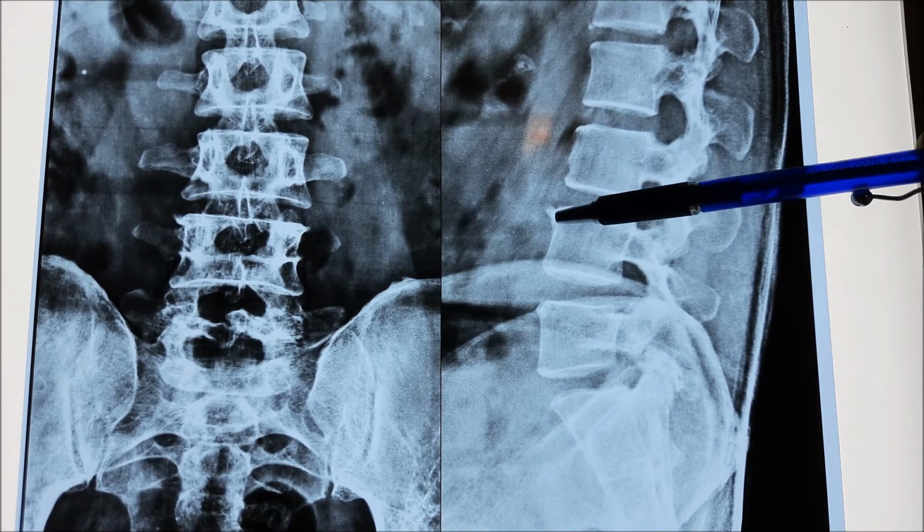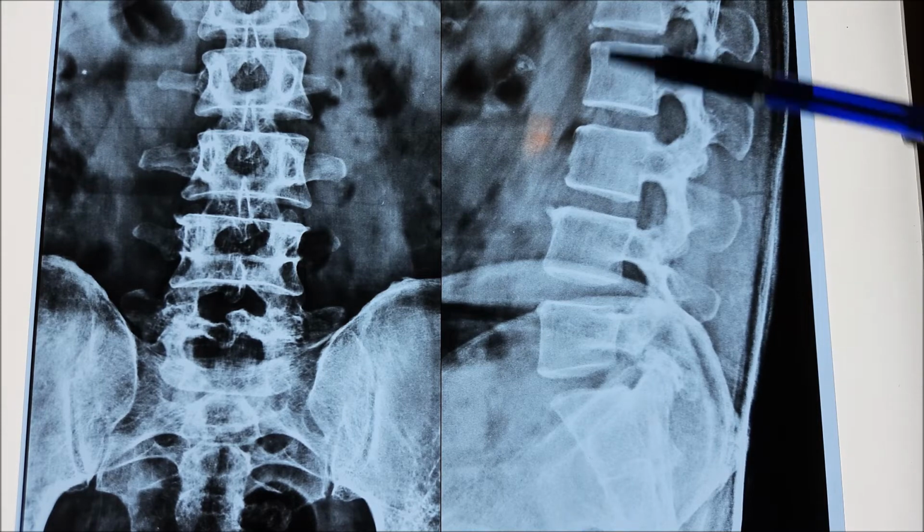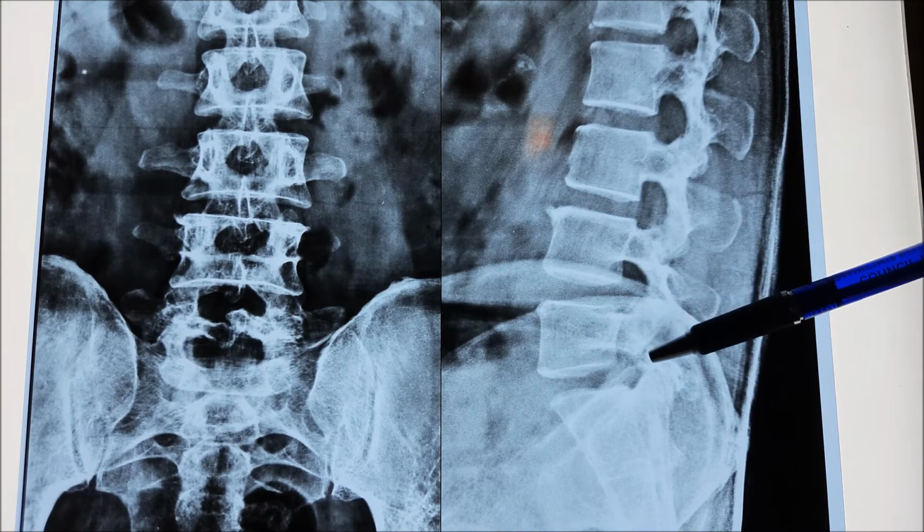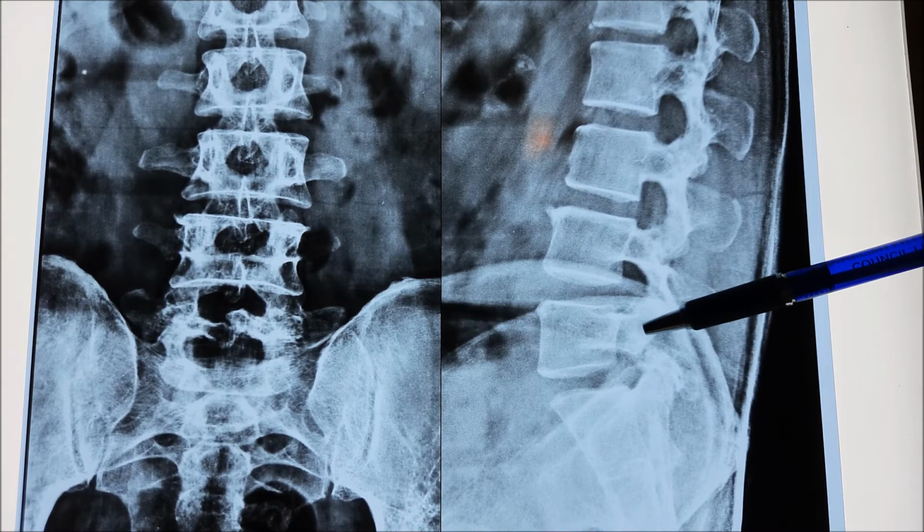He is having age of 50, so it's quite normal. And the curvature, it's okay. No other areas he is having any fracture sites. So one finding we got from the lateral view.